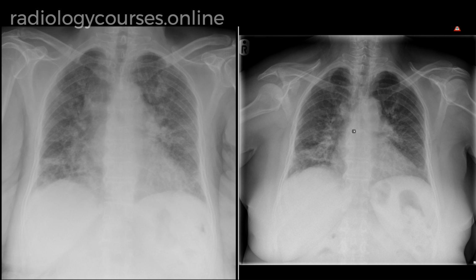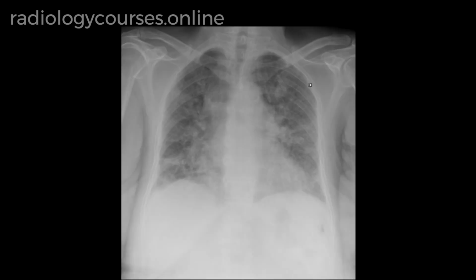On the previous radiograph, again, both hila appear bulky with most likely right lower paratracheal mediastinal enlargement suggestive of lymphadenopathy. So based on these findings, features are likely to represent progressive sarcoidosis. Other differentials, such as tuberculosis, are less likely given no cavitations or extensive consolidation or fibrosis in 8 years' time. I would like to confirm the diagnosis by performing a CT scan of the chest, especially HRCT of the chest.